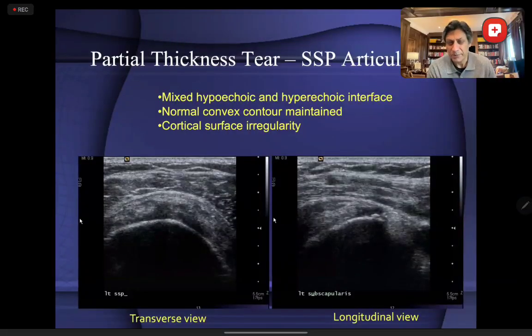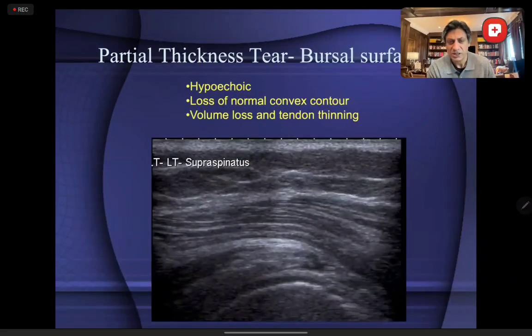On ultrasound, it's a similar appearance. Tendons are bright, but if you see black areas, so see the black area here, that's the tear. That's how it looks on the ultrasound. But of course, we are looking at the MR today.